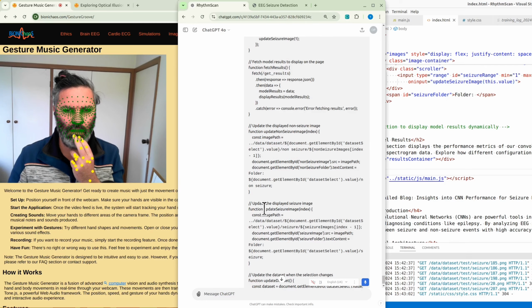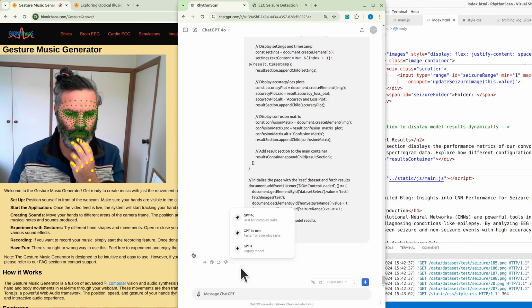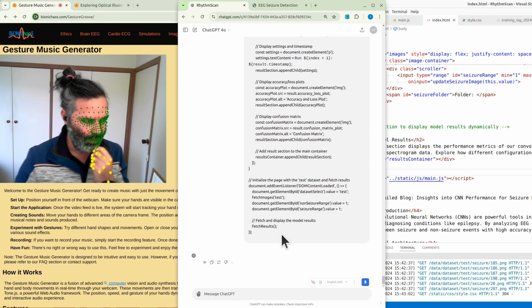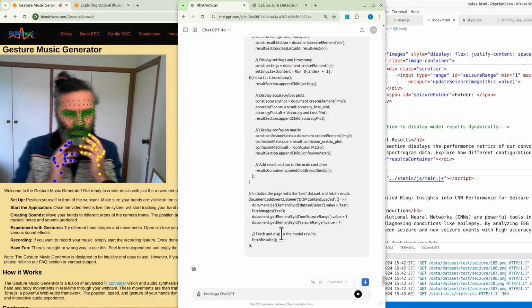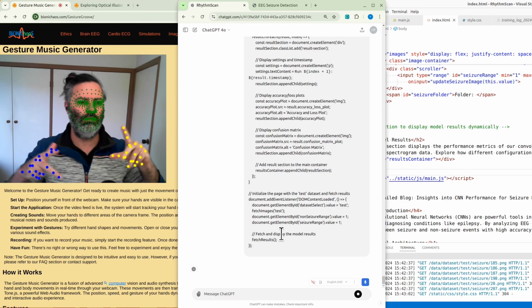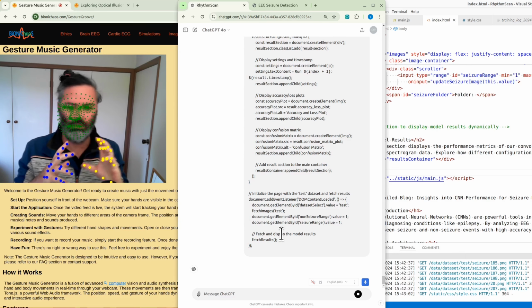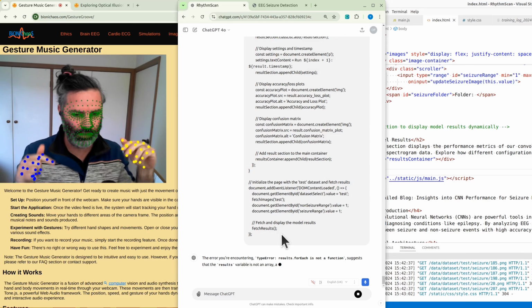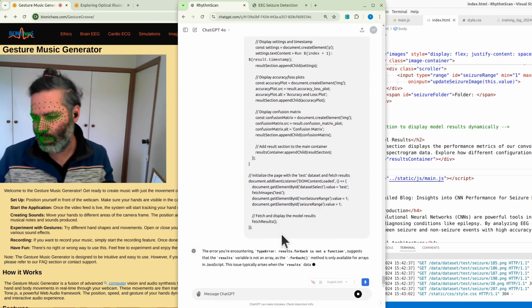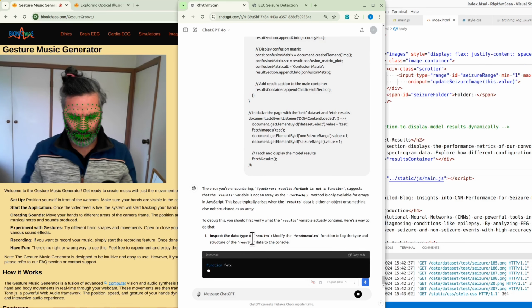Generating what? I need to regenerate. Have to make sure I keep my hands below a certain level on the screen, because when I go higher, the volume goes higher.